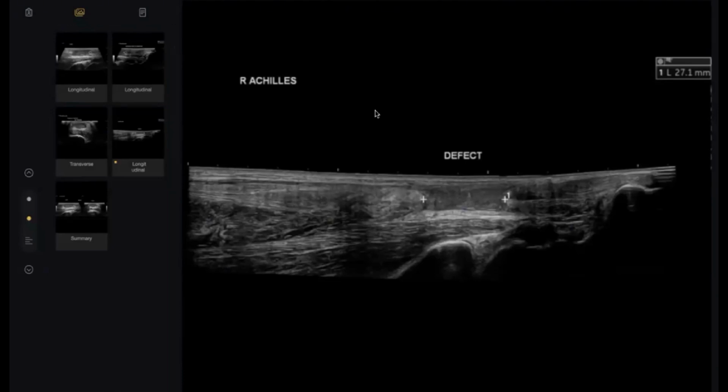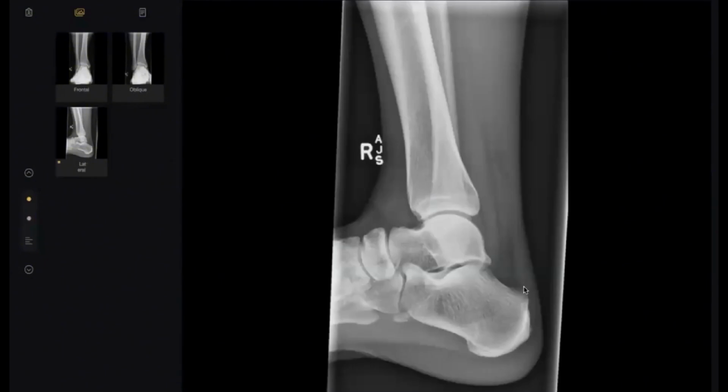The most important in this case, my colleagues, is that it is really very easy to be missed. But here, look, just some irregularity and ill-defined, and this piece of soft tissue looks like cut from here. At least, I think this is a tear itself. At least you have seen that the Achilles tendon soft tissue is not normal.